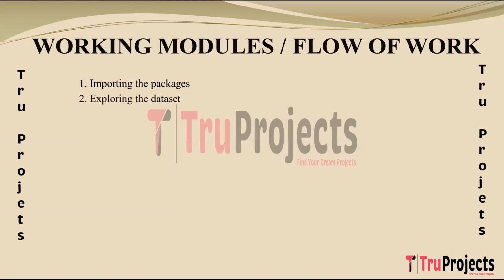Exploring the dataset. This section involves acquiring and understanding the dataset related to knee osteoarthritis KOA. It involves obtaining knee X-ray images from a specific dataset dedicated to KOA or utilizing data obtained and pre-processed from RoboFlow, a platform that facilitates data preparation for machine learning tasks. Exploratory data analysis (EDA) includes assessing data quality, understanding label distributions, and visualizing sample images to gain insights into the dataset's characteristics.